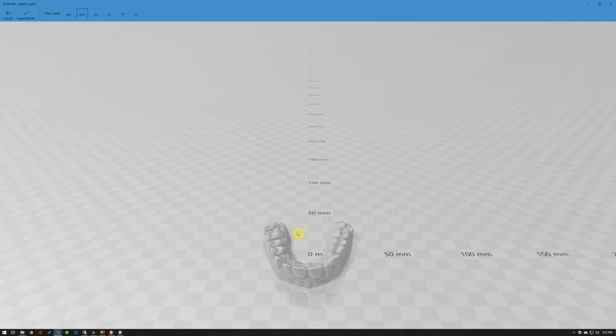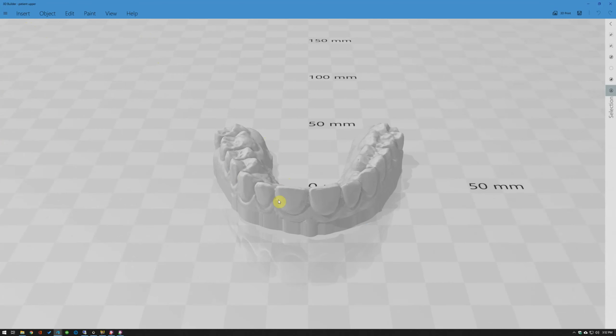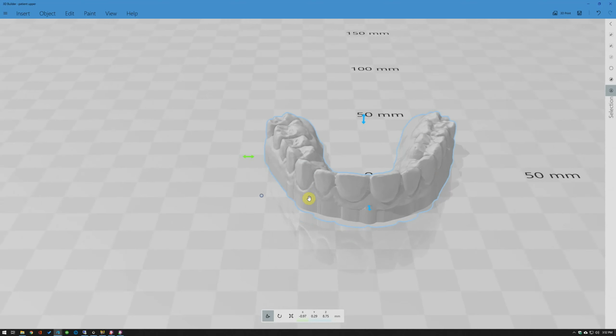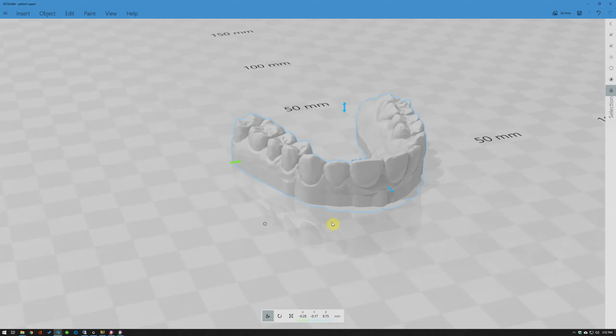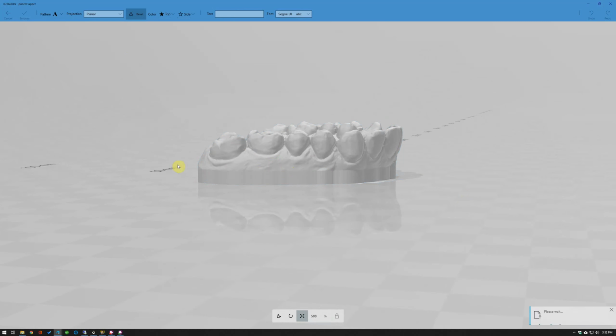We'll see it's based. First thing you have to do is click import model, very quick, then select it. You'll see now it has a blue halo. The model is selected. I will then grab it and turn it to the side. I always like to label here in this area. So we're going to edit and emboss. And I always just emboss with the patient's last name in capitals, just the way I tend to do it.